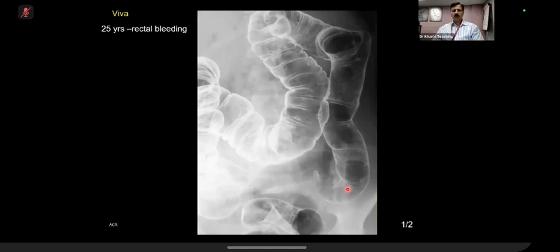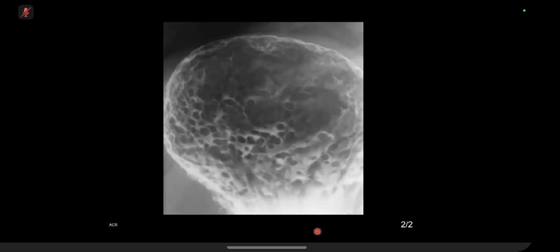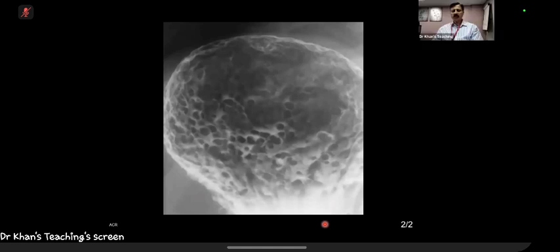Right. So the point is that this is the same patient. What is this, and where is it? So that's in the stomach. So multiple filling defects along with surrounding contrast. So that is the fundus of the stomach and multiple polyps. So I'm concerned about hamartomatous polyposis or varices. Excuse me, this is the same patient as the previous one.